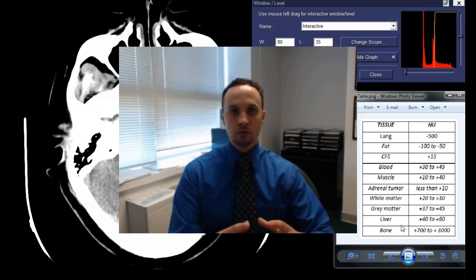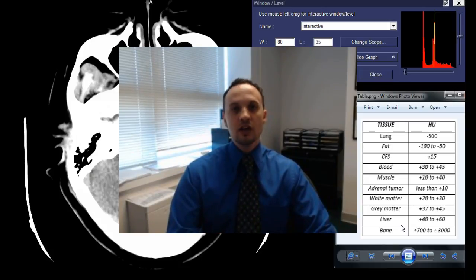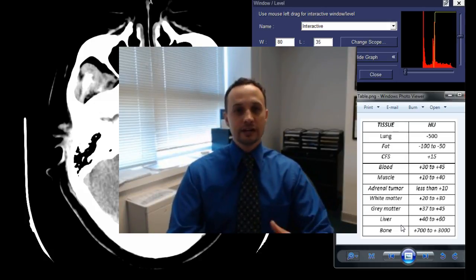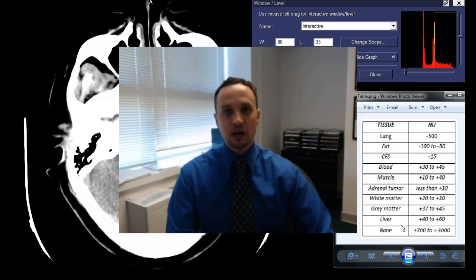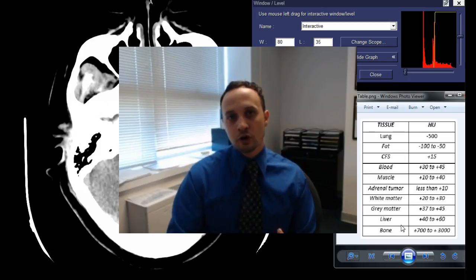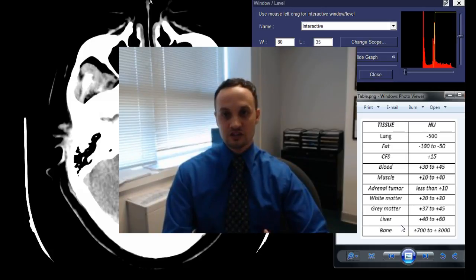So really the goal that I'm trying to go through, I will look at a CT scan of the head and we'll break down what it looks like under a bony-based window, so looking at those cranial-based structures, those facial bone structures, versus what it looks like on the brain window, and how manipulating these values allows us to visualize various structures without having to repeat a scan, for example, and utilize different techniques, but we can just simply manipulate our values post-processing and be able to really visualize those structures that we want. So that is the goal, is just to further break down window width and window level so you can really understand these concepts, and it's not just a definition, but you can actually physically see these changes as they're being made.